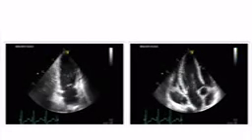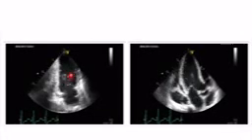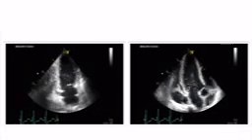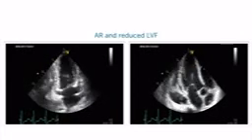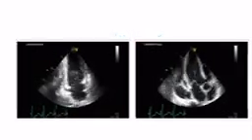Here it is reduced, maybe more than in the previous case. So we have a patient with significant AR in the presence of heart failure maybe already. Yes, this patient definitely needs surgery, and we can only hope that he will still benefit from surgery, given that his function is probably already severely reduced.